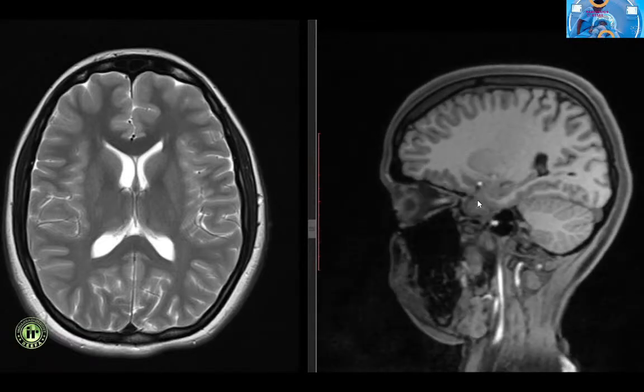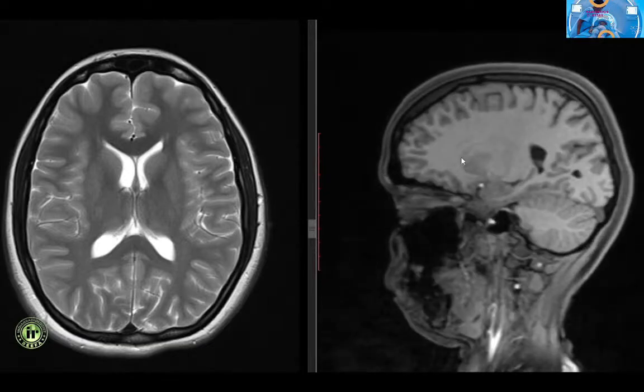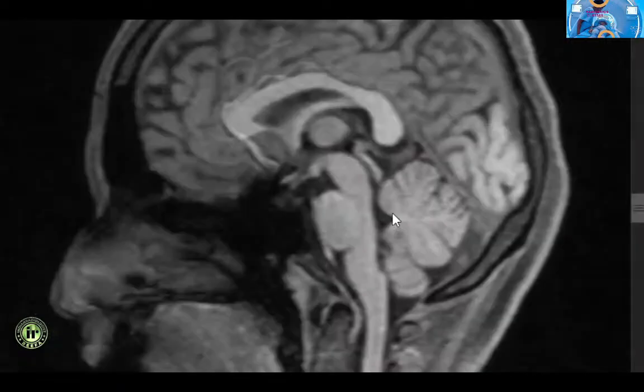Each lateral ventricle has a temporal horn and an occipital horn projecting into the temporal and the occipital lobes respectively. The third ventricle is a narrow midline structure with diencephalon as its boundaries. The fourth ventricle appears triangular in sagittal section. It has an anterior floor and a roof with two sides converging to a posteriorly directed apex.